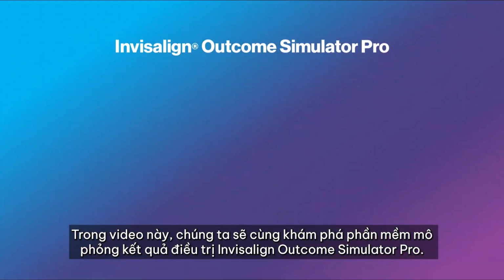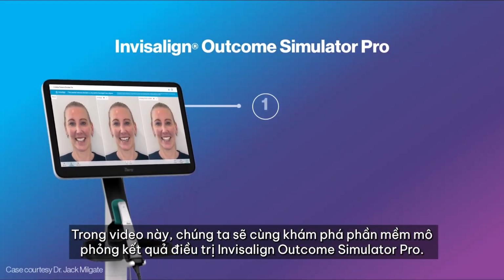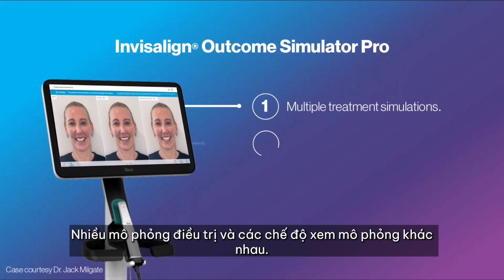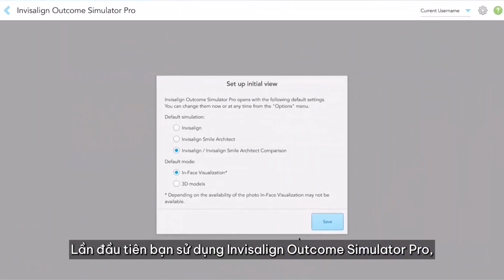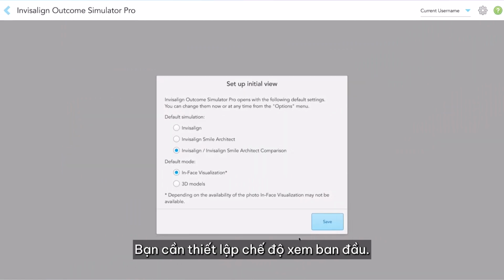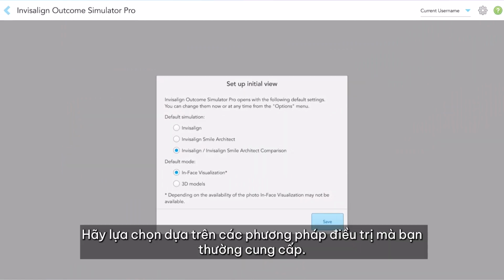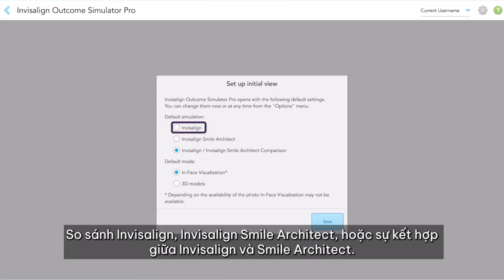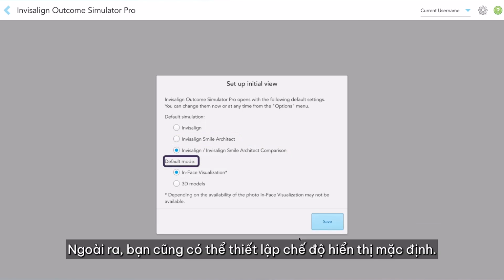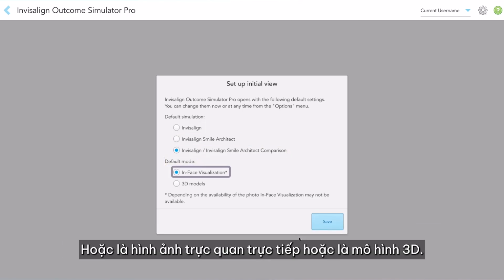In this video, we'll explore the Invisalign Outcome Simulator Pro, multiple treatment simulations, and the different simulation view modes. The first time you use the Invisalign Outcome Simulator Pro, you'll need to set up your initial view. Select it based on the treatment options you usually offer. You can choose a default simulation, Invisalign, Invisalign Smile Architect, or Invisalign and Smile Architect comparison. In addition, you can set your default display mode, either in-face visualization or 3D models.